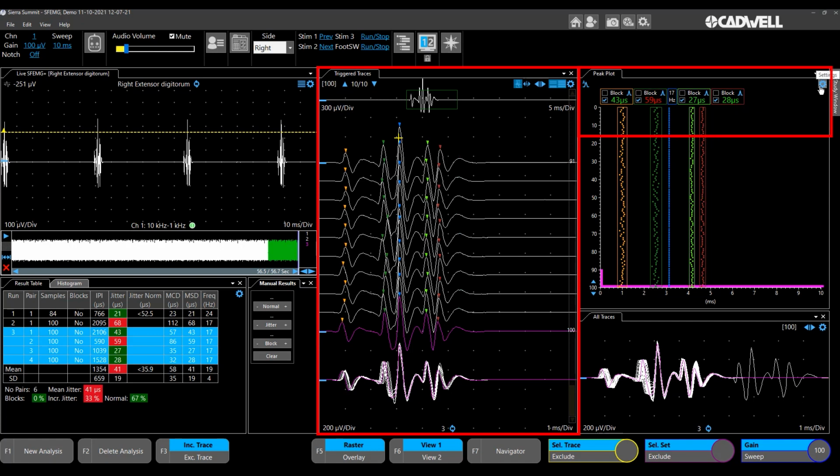If you go to the cogwheel, you have the option to have automatic blocking on or off. If this is on, then it will automatically mark peaks as blocking when the jitter is present and the peak is appearing and disappearing in the data set.